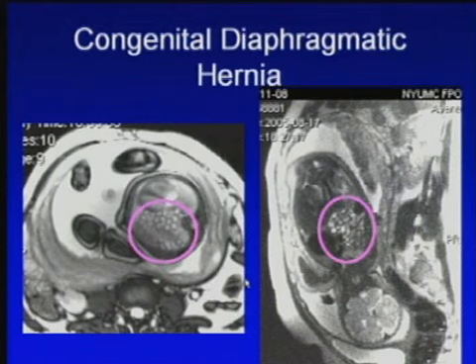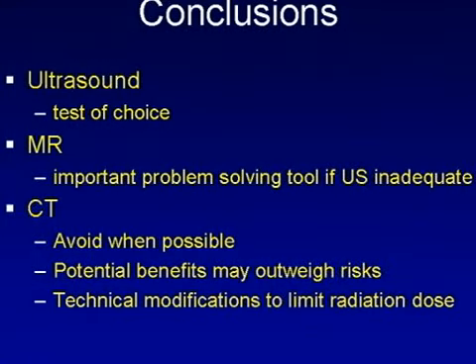The surgeon who was going to operate on the fetus wanted to characterize this a little bit further before the fetus was delivered, and this is a true FISP. This is a haste image, and it shows you that basically all of the fetal bowel was located in the thorax, and here's the heart, which is shifted way over to the right. And this fetus actually did well. After being delivered, the surgeons performed surgery thoracoscopically to repair the diaphragmatic defect, and the baby did fine.